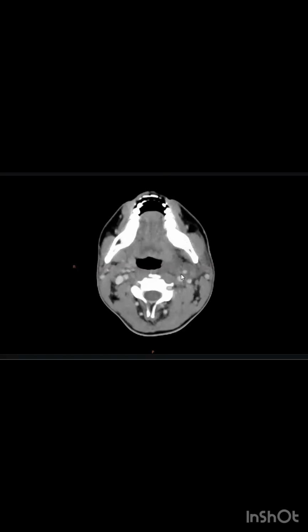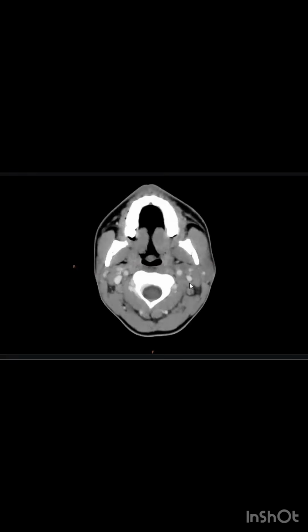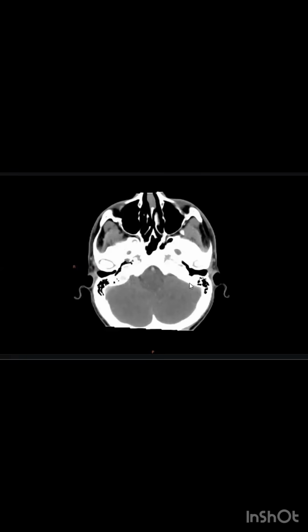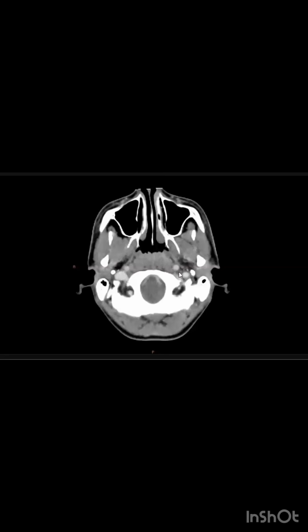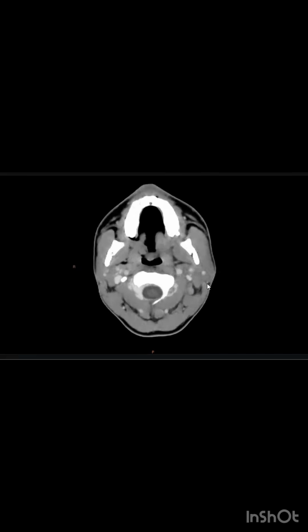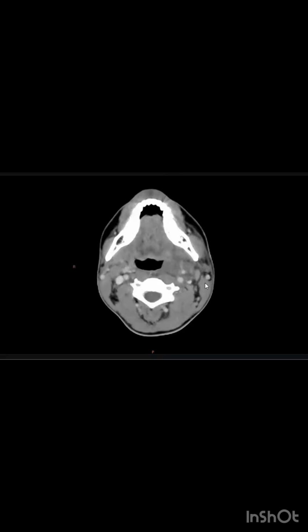In a patient complaining of neck pain and swelling, fever, and sore throat, what are you suspecting? I'm concerned about parapharyngeal abscess, so I'm trying to look for any developing abscess, but I can see only phlegmon formation in the left parapharyngeal region with multiple lymph nodes. There is no evidence of any collection with enhancing wall, but I believe this whole area in the left parapharyngeal region as well as anterior to the spine and along the carotid spaces is a phlegmon as a result of the inflammatory process extending. There is, however, no extension into the mediastinum.